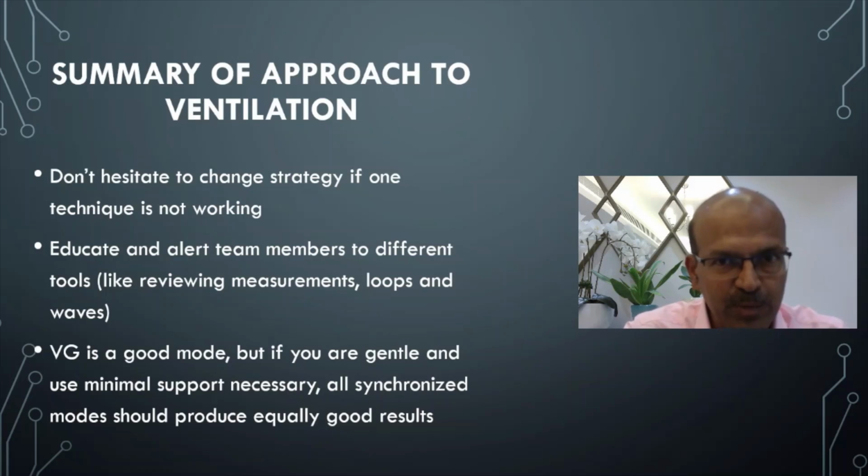Adjusting the tidal volume is of course an option, but you can change the modes as well if you are more comfortable with that. So this is just to give you an idea that you don't need to be dogmatic in the approach. Of course, in my experience, 90% of the time volume guarantee works well, but you have to watch for the 10% where it doesn't, and don't hesitate to switch.